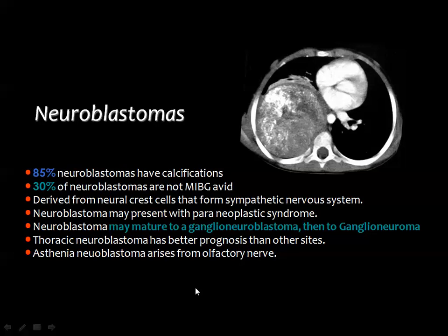Then neuroblastoma is a big mass in the posterior mediastinum, and one of the clues for being a mediastinal pathology is the compression of the lung, meaning that this lesion is outside the lung, compressing the adjacent parenchyma. Calcium is present in neuroblastoma and detected in about 85% of cases by CT. And this neuroblastoma may have an extension inside the spinal canal.